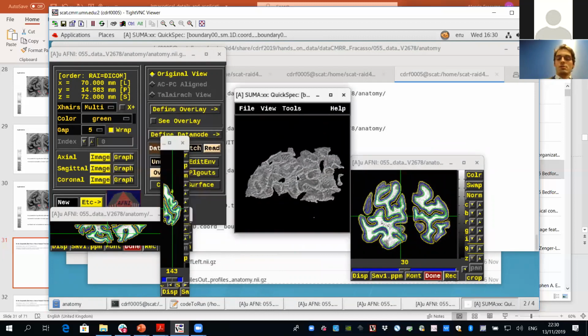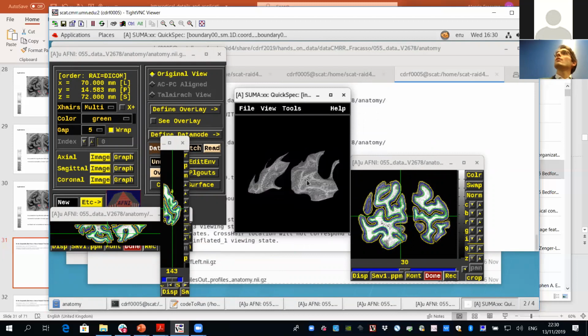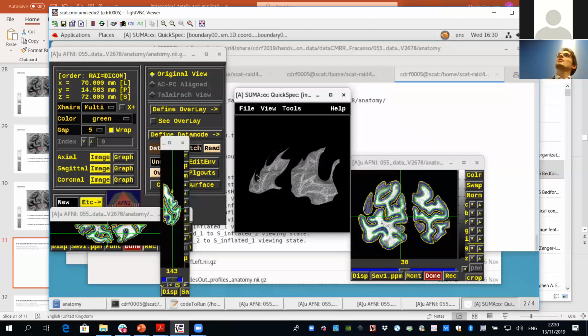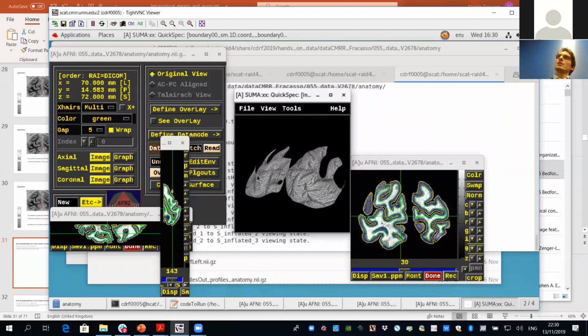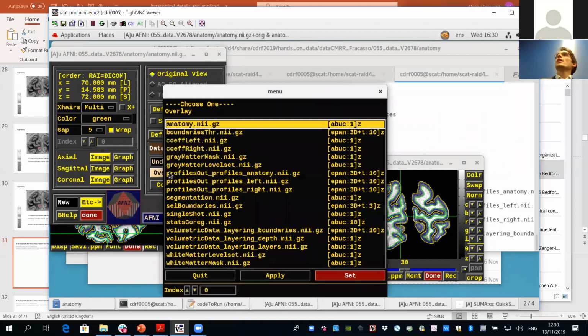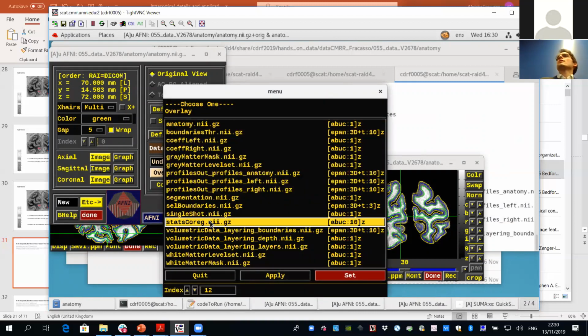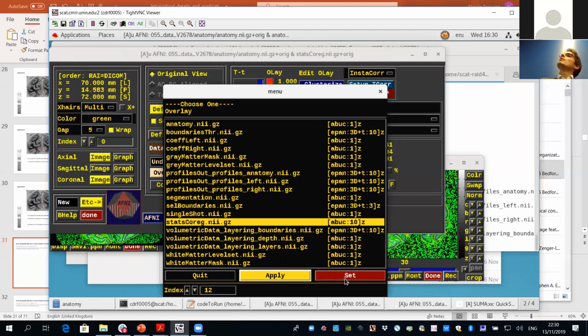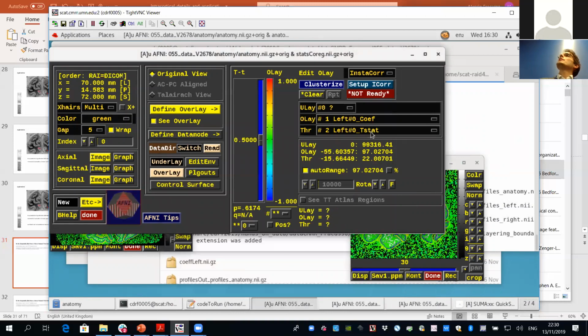And here we can, there we go. Where am I? This is the surface generated and inflated from the white matter border, approximately in the middle, and from the CSF. Let's stay approximately in the middle. And what you can do in this case, let's add some stats here. Yes, we can project the stats on top of the volume. And we take these ones, okay.